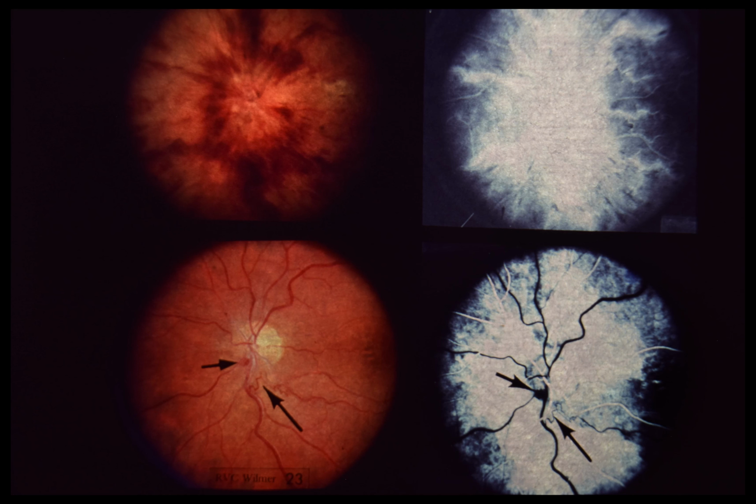Slide 23, papillophlebitis. This 33-year-old male noticed blurred vision in his left eye that cleared within several hours. During the next few weeks, he experienced intermittent blurred vision always in the left eye. Visual acuity was 20/20 right eye and 20/25 left eye. The left visual field showed enlargement of the blind spot. The right eye was normal. Upper left. The left optic disc is edematous and surrounded by superficial, flame-shaped hemorrhages. The retinal veins are dilated and tortuous.